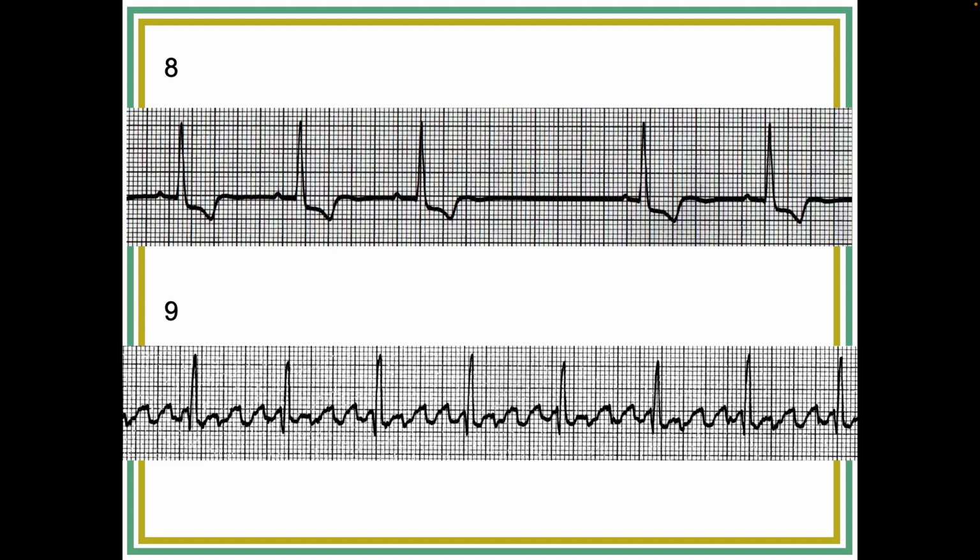Now, are flutter waves P waves? Actually, some people do call them P waves, but more commonly they're called flutter waves, or sometimes you'll see small F waves. I think F waves is just too confusing. I just call them flutter waves, and mostly I'm distinguishing them from the other depolarizations of the atrium.